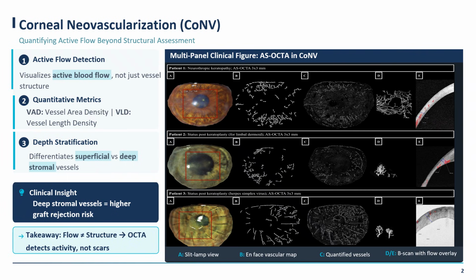Now, if we depend only on a pure slit lamp examination, it might be difficult clinically to determine whether these blood vessels are functioning or just ghost blood vessels. Now the decision is completely different. If you have a flow inside these blood vessels, this indicates activity. However, if there is no flow and empty blood vessels, this will not indicate activity.